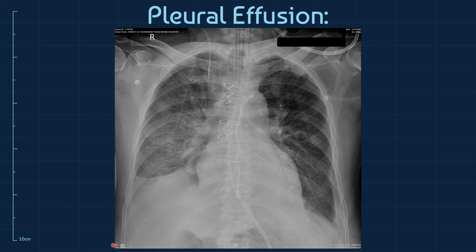And also note that pleural effusion will appear on a lateral X-ray with only 75 ml or more, and it has to be over 500 ml for it to appear on a supine chest X-ray. So obviously this patient is standing upright, he's erect, and that's why we get that meniscus effect. It will be a little different if he was lying down, but this is a PA radiograph, and hence why gravity causes this sort of meniscus effect in pleural effusions.